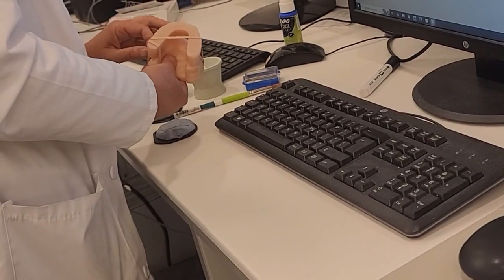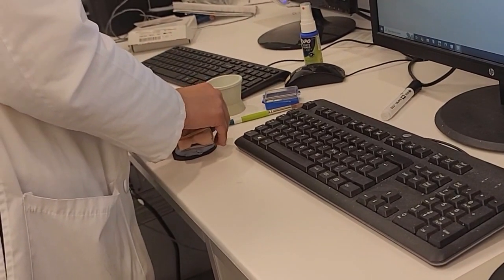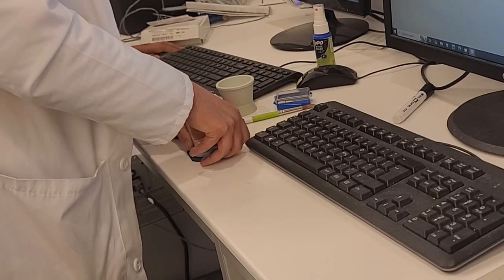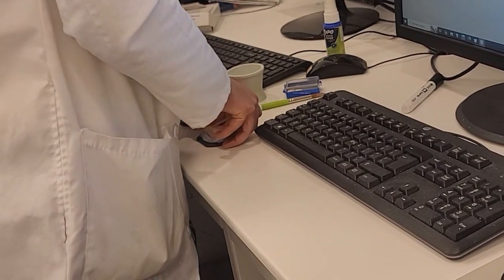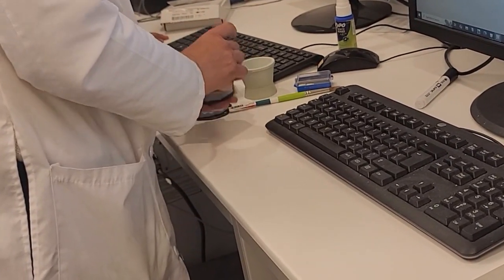Yep. And you know, the rubber band doesn't make it any easier either. Sometimes what I do, if I have a little bit of soft lab putty, I use that to help me anchor it. Let's give it a try. See what we get.